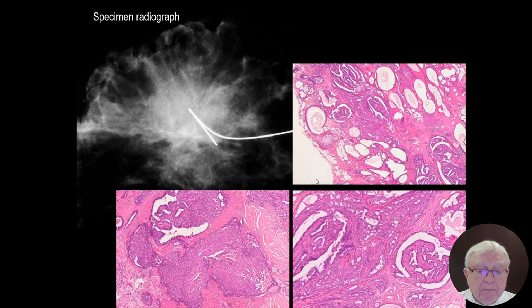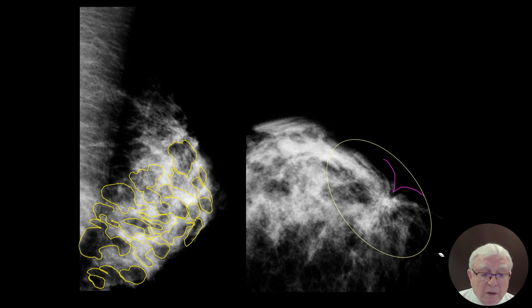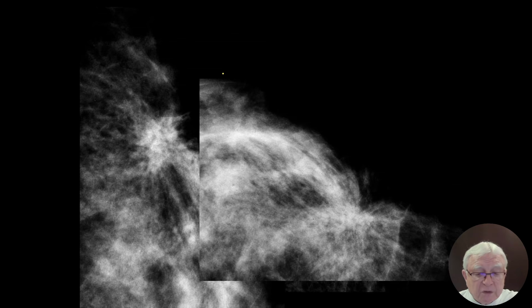Black star. Here we go. And then you're scared because there is so much cell proliferation. Fine. But this is all hyperplasia. Do you see the notch again? Still not palpable. Large. Look at the black in order to see the white. There it is. Once again, the radiating structure is too large to be a cancer. And I think it's black star.